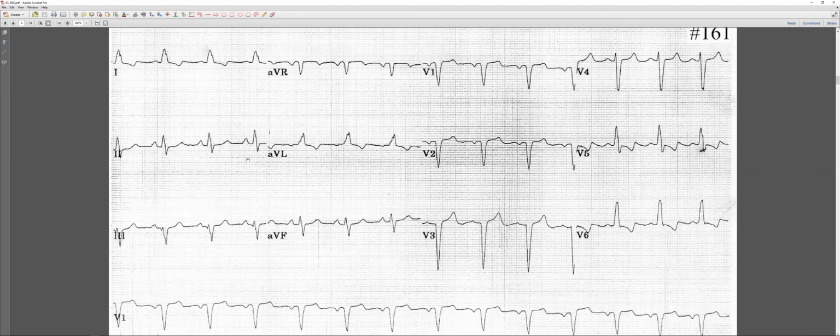And what else do I see? I'm not very sure how relevant this structure is. But you haven't answered me. You said that there is some abnormality in the conduction inside the ventricle. So what can it be? It could be a bundle branch block. Yes, it can be a bundle branch block. Which one, right or left? That's the question here.